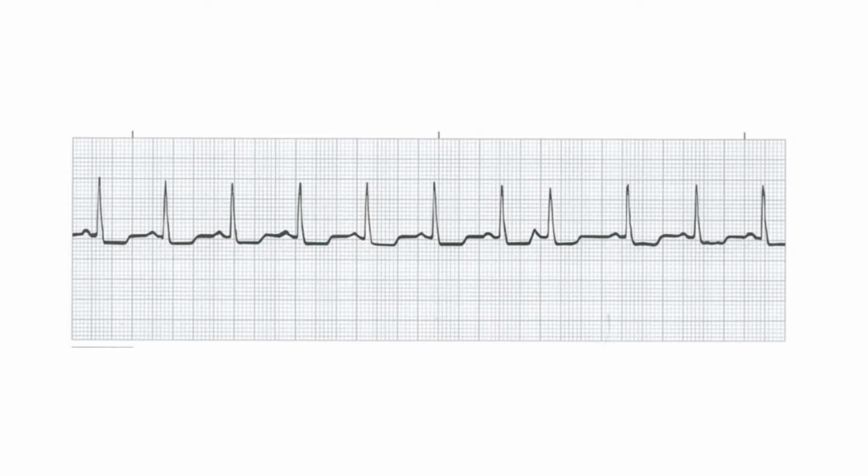On page 121 on 7.54, this one looks different. If you can see this PAC, the P is all up in the T because it came very early, and it is very difficult to pick that out. But if you compare to what the other T waves look like, that's how you know that it's a PAC, because it does look different. It's got a normal QRS, it's got a P up in the T, and the premature beat has a non-compensatory pause.